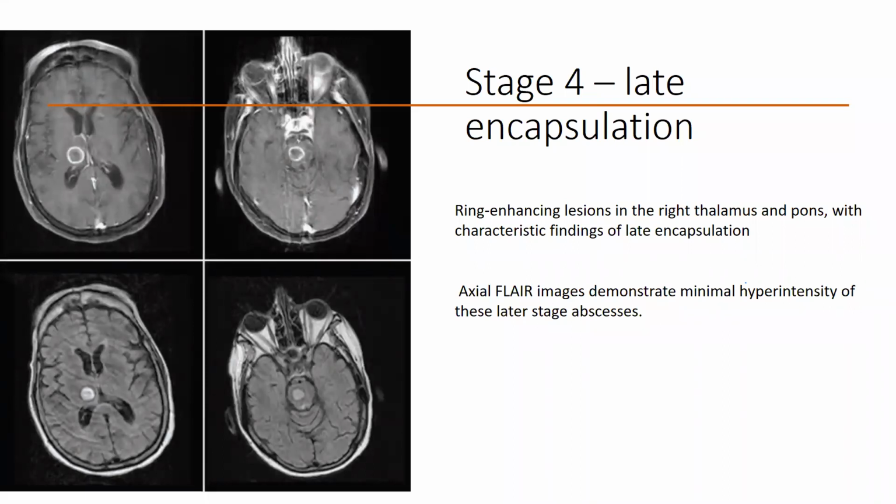So I think these things will help you to differentiate, and also the location. The gray matter white matter junction is what is usually commonly affected in NCC. Miliary TB will be diffusely involving everywhere, and the posterior fossa also might be affected. So the location, size of the lesion, cystic appearance versus nodular appearance, and a large number of lesions in miliary TB will help you to differentiate.